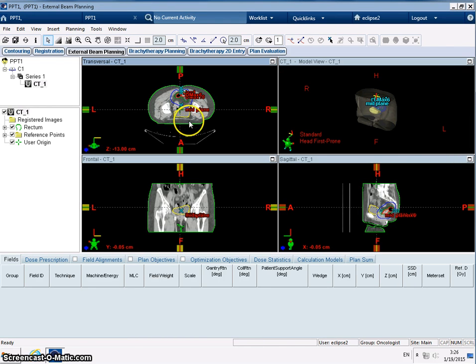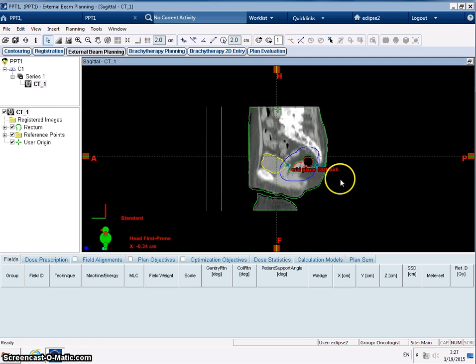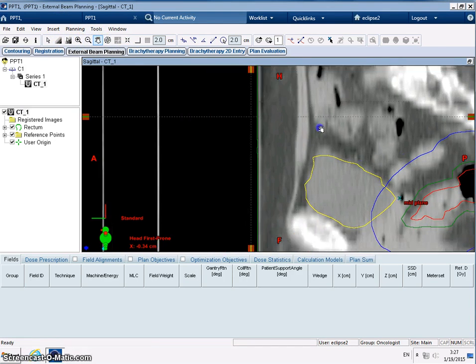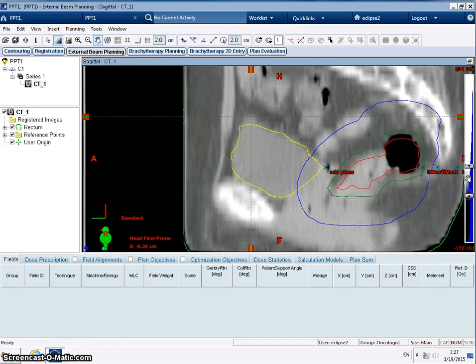And if we click on the patient, left click, we can scroll up and down the patient, and as you can see this line here as I scroll up and down represents where we are in the patient, and we can scroll anterior to posterior in the patient, and in the sagittal view we can scroll left to right, and again we can maximise those and minimise those as we want. We can use this zoom function, so we click on zoom, we can draw a box around an area and zoom in on it and then zoom out. We can pick our hand up and we can move the patient around, and we can change the window level on the patient as well. So again, have a play with all of these and see what they all do.